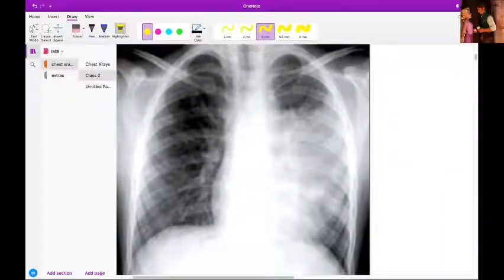So right now we're talking about pneumonia. Okay, so this is in reference to pneumonia. Mostly it's intra-lung pathology, so mostly it'll be pneumonia. Okay, which lobe is affected over here?